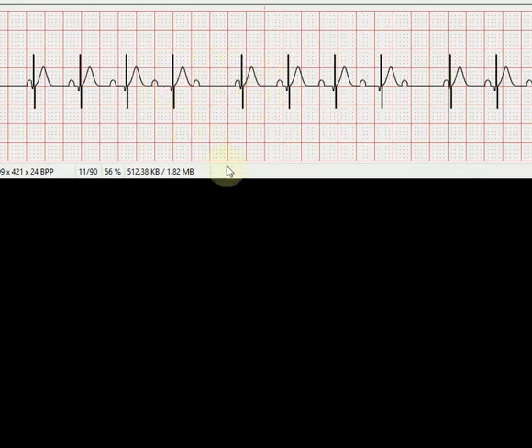Not so much. I've got more P waves than I have QRSs in here. How about PR interval? Is it consistent or inconsistent? Well, take a look at that PR interval there and that PR interval there. It's not even close. So PR interval is inconsistent on here. And this is our happy dance time once again, because remember, for the core rhythms, there's really only 2 possibilities.